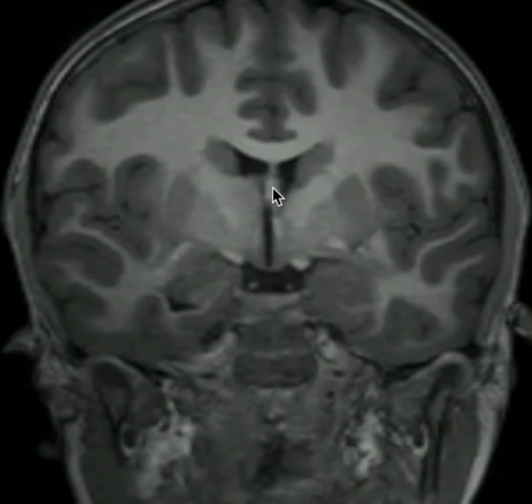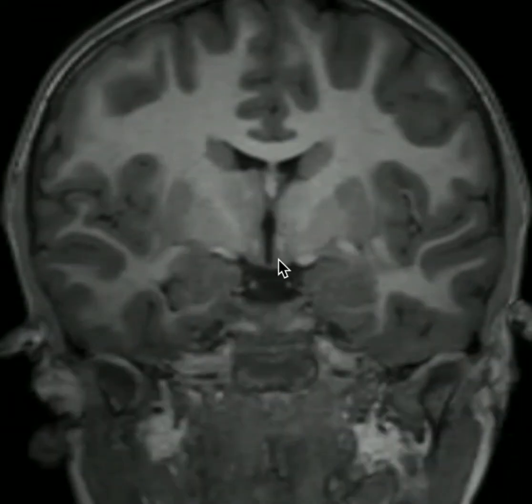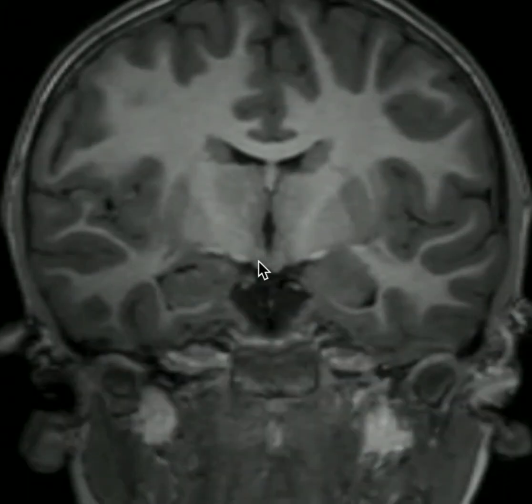And now at this point, we're seeing the columns of the fornix. The columns of the fornix will arc anteriorly before going back down posteriorly into the mammillary bodies. So to follow these white matter fibers I'm seeing here and here, I'm now going to scroll posteriorly a few slices and watch them go down inferiorly and posteriorly to reach the mammillary bodies here and here. Sometimes these may become atrophied in mesial temporal sclerosis, as may the rest of the components of the fornices that we discussed.